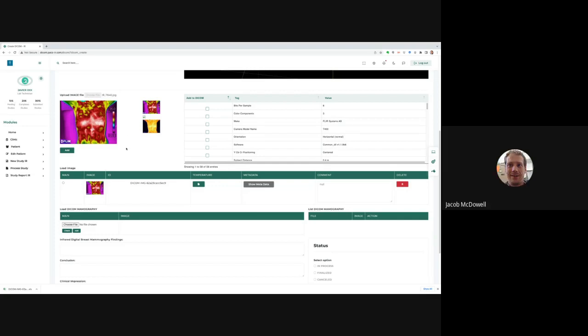Now, will this work on any JPEG? On any FLIR JPEG, this. Okay. I mean, we have the algorithm to grab the metadata from a FLIR JPEG file. But if, for example, we put what you sent us in the SDK, we can include Spectrum IR or ICI or whatever. We can detect what type of file we're getting, and we can use the proper algorithm for that.